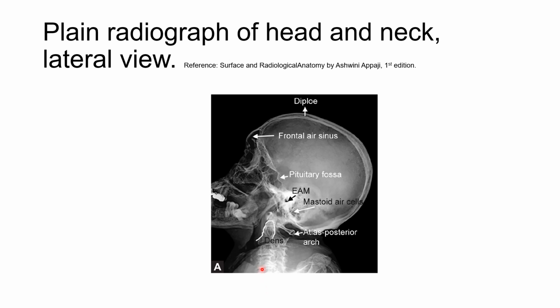Then you can see the false dentures in this patient, meaning the false tooth that they have implanted, or sometimes they just implant a cap over the tooth. It may be made of metal, so you can see it has a different density than the bones. Now here you can see the posterior cranial fossa in this part. So try to answer as much as you can see.